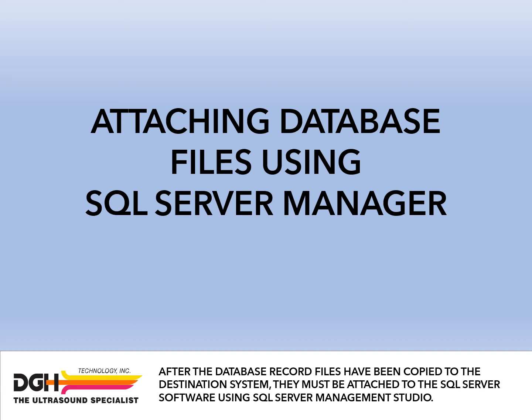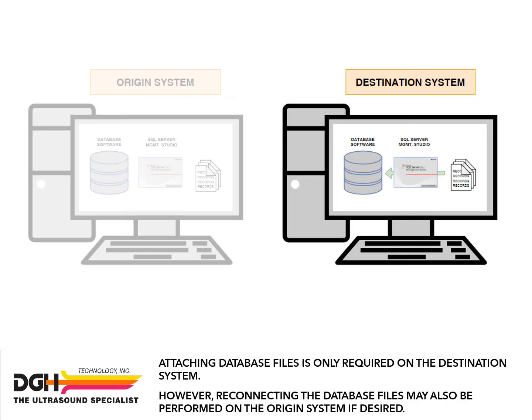After the database record files have been copied to the destination system, they must be attached to the SQL Server software using SQL Server Management Studio. Attaching database files is only required on the destination system. However, reconnecting the database files may also be performed on the origin system if desired.